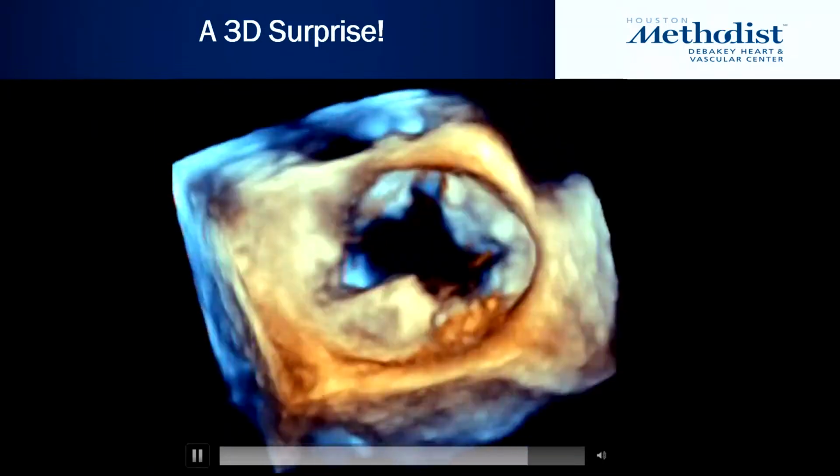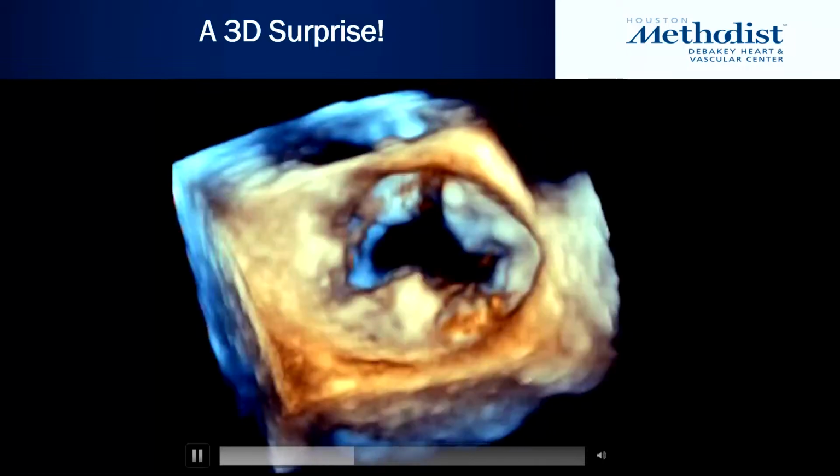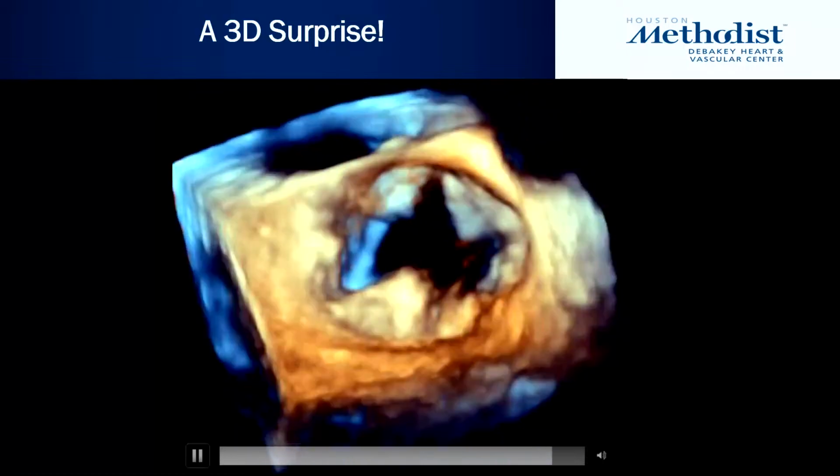But in addition, there was an anterior cleft. So 3D can unmask some pathologies that are otherwise not revealed by 2D imaging.